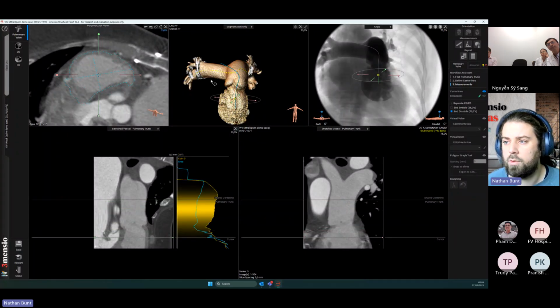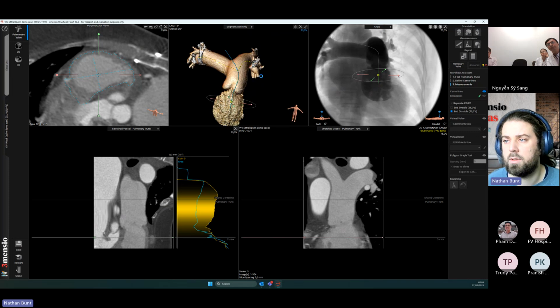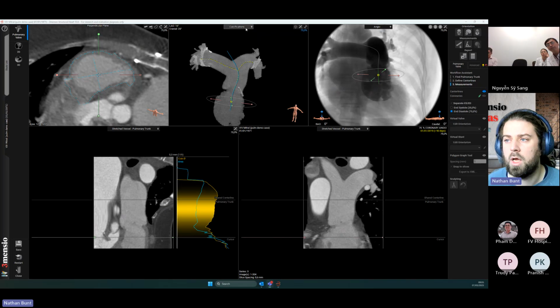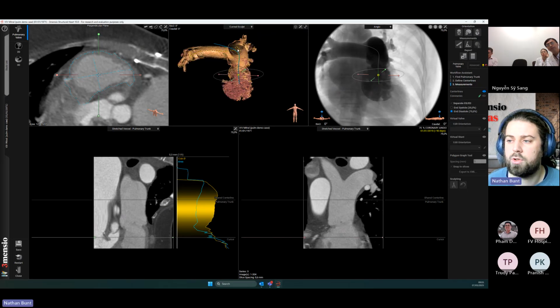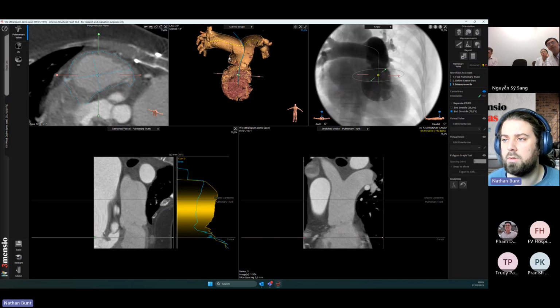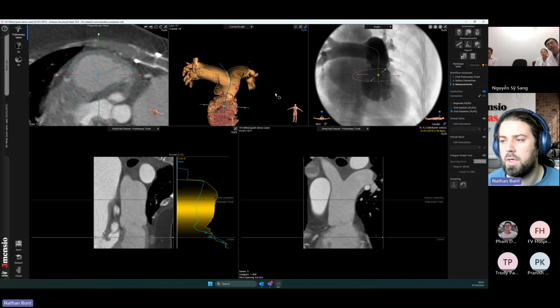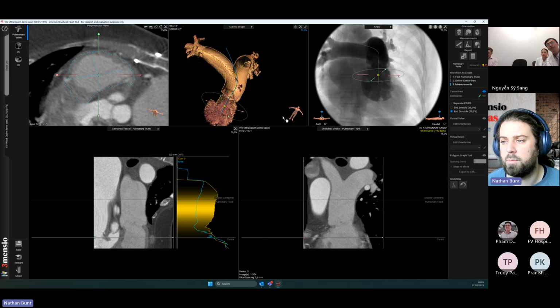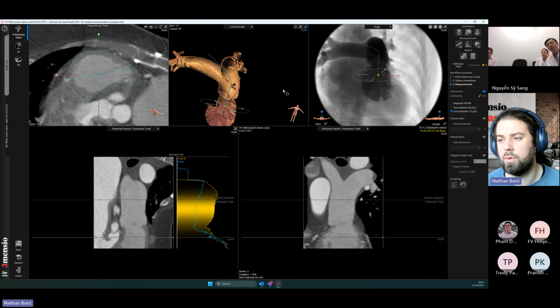Then we've got a volume rendering view in which we can appreciate the anatomy as well. Apart from that, a dim background, volume rendering view, heart and calcifications view are available. But in the pulmonary trunk module, we also have a curved sculpt available in which we cut the pulmonary trunk in half basically and open up the anatomy in that way, which might still give you a bit more insight on the pulmonary trunk.